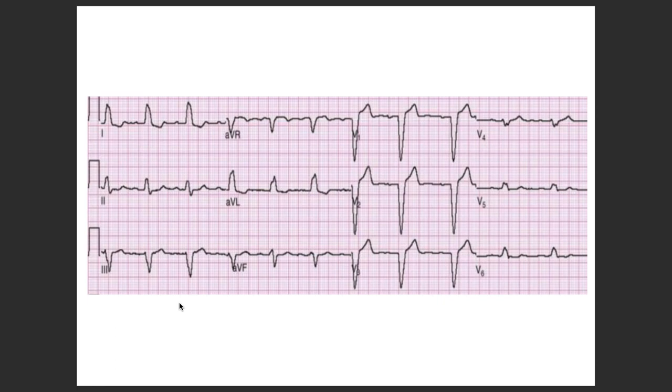Okay. Now, coming back to our ECG. We have diverted enough to get a good number of basics. How do you differentiate a left bundle branch block and a right bundle branch block? So seeing this ECG, even this, there's a trick. How much are you all aware of this?